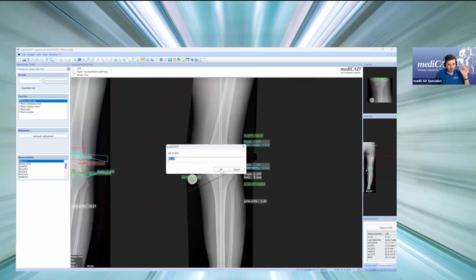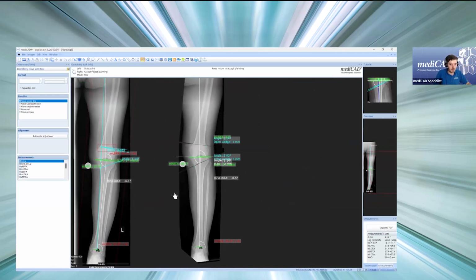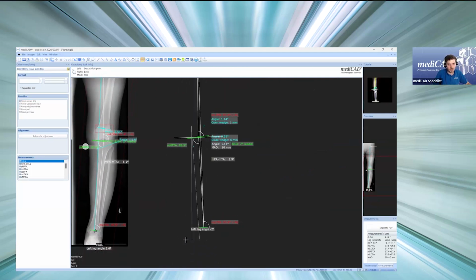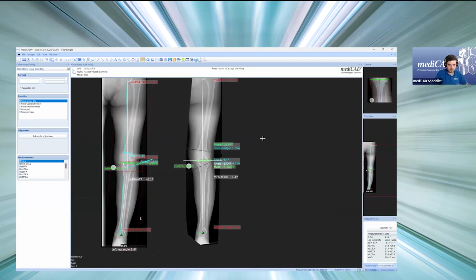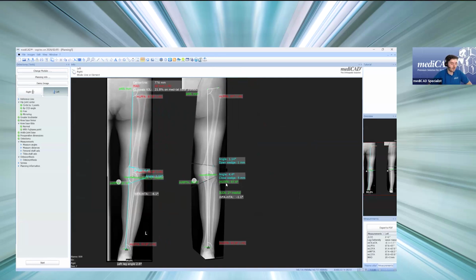And obviously this works for any adjustment feature that we have, setting the MMPTA or MLDFA. Also obviously moving the center line still works as well, but we only adjust one cut each time, and then we can switch back and forth if we want to. Then we can apply. So I think I covered most of the features here now with these quick sessions through our modules.